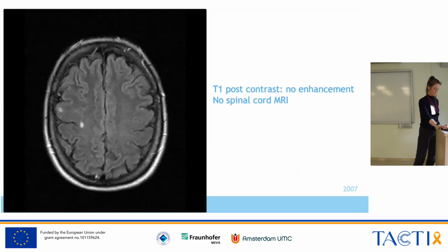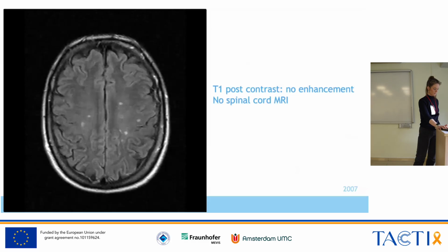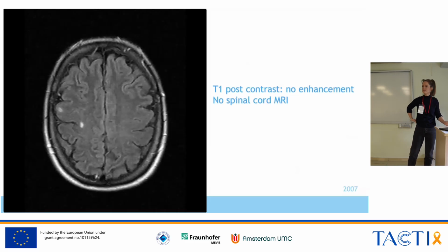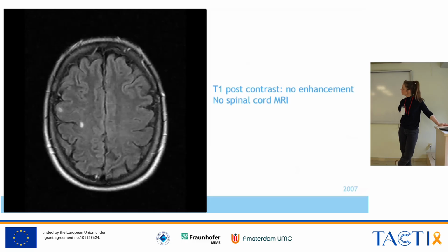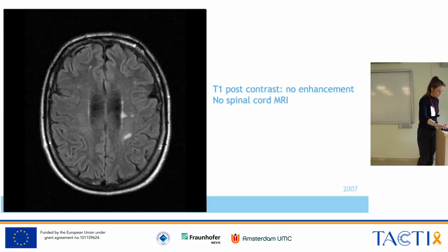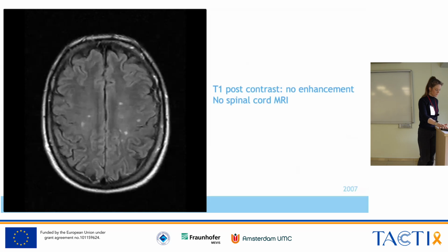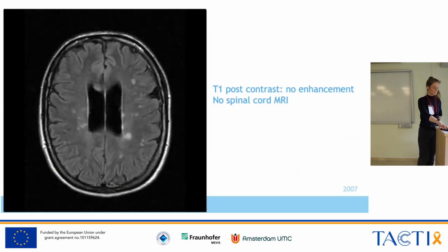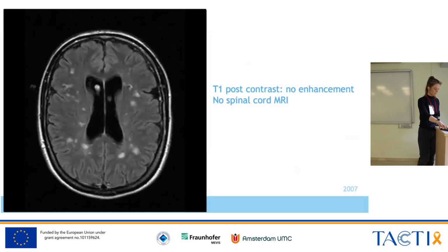And also I see some lesions that are suspicious, like for example the one, can you go 2 slices up? So this one might be a juxtacortical lesion, not quite sure yet because maybe there's still some white matter in between, and there was also on the left side something that looked like a perpendicularly standing periventricular lesion. Oh, that was this one? Yeah, that one. So as a guess, and I don't know how this case will evolve, it could be a mixture of vascular lesions and MS lesions.